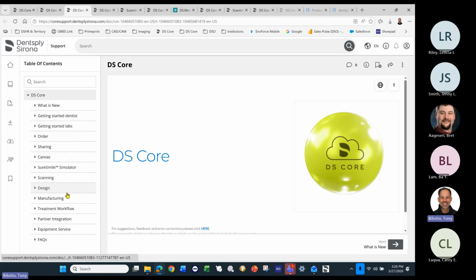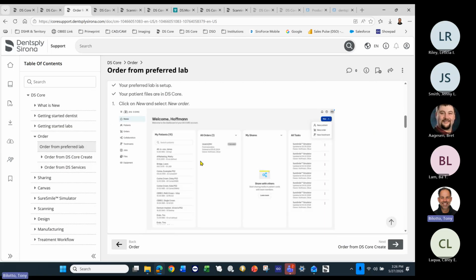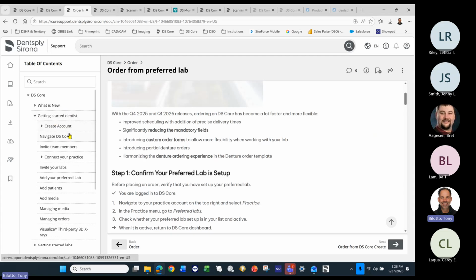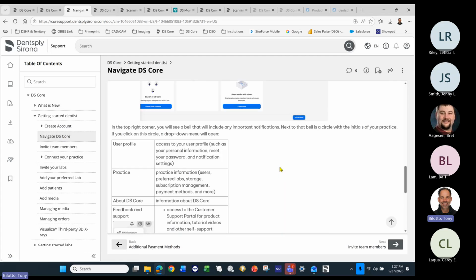There's a frequently asked questions section, and ordering in general is covered here as well. There's a getting started area, how to navigate DS Core. This is a video that I had on the sheet already. Lots of resources are available.